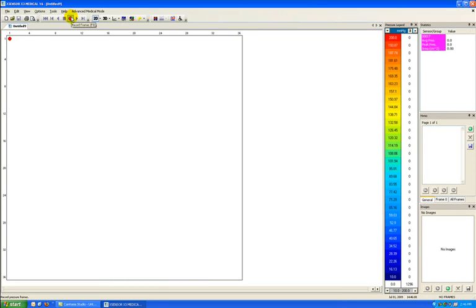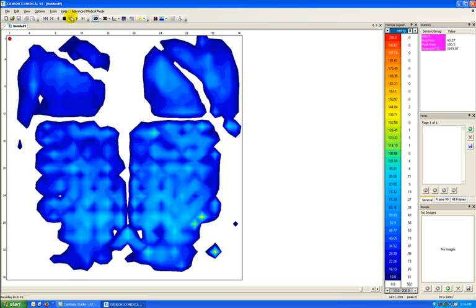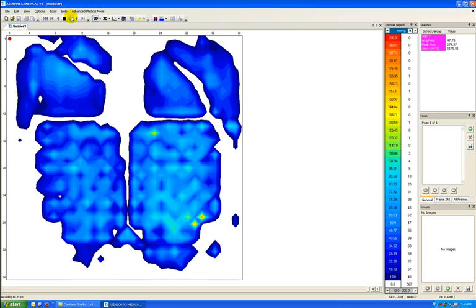The first and most critical thing I'm going to show you how to do is how to record. So we look to the bright red circle in the upper toolbar. Clicking on this bright red circle will actually begin the recording process. I'm sitting on my LX100 363602 sensor on top of a mix of a foam and air bladder wheelchair cushion right now. So when I press record, I'm actually able to see the pressure image for the first time.